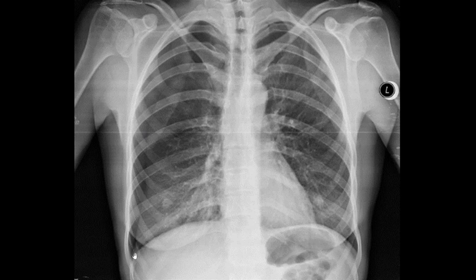If you look closely, from here this line starts and goes up, and you see how it caves in here and comes somewhere here to the end. So this line is actually the visceral pleura. So there is a pneumothorax here. This here is all air, and this air pushed the visceral pleura away from the parietal pleura all the way to here. And this is a pneumothorax that has developed.